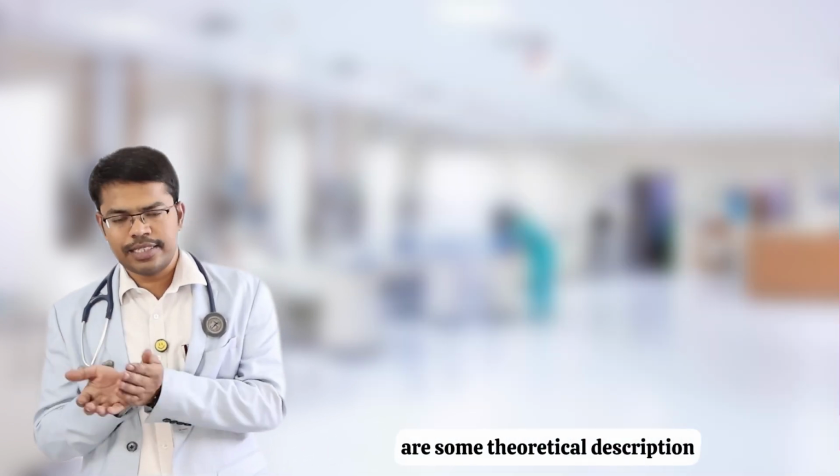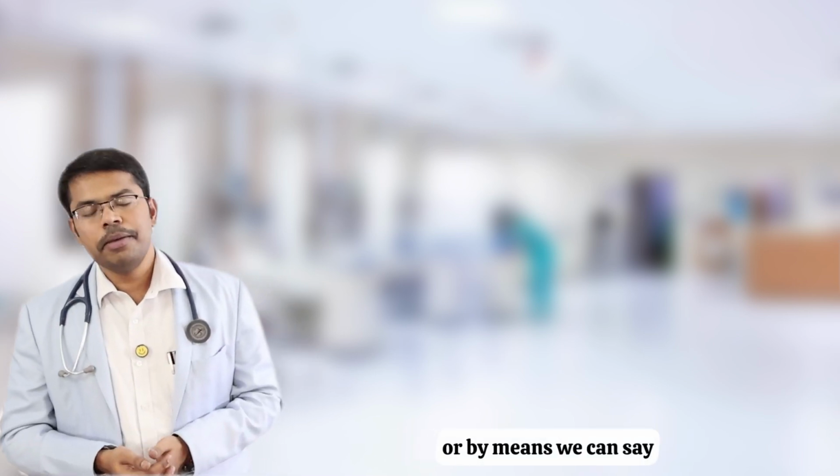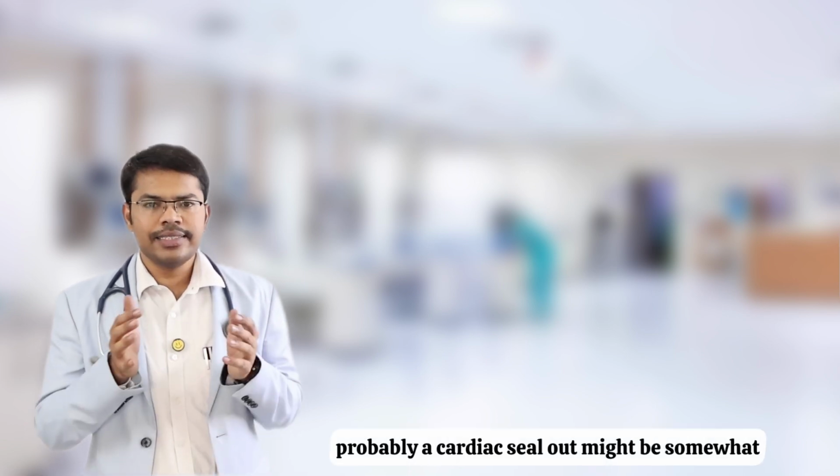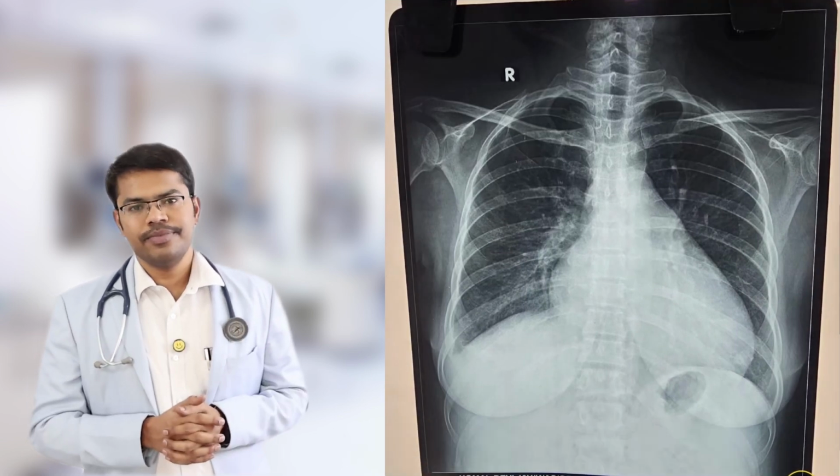These are some theoretical descriptions. But if you find a globular heart, or by means we can say money bag appearance or water bag appearance, that is the large category. Whereas in moderate, probably the cardiac silhouette might be somewhat bigger, cardiothoracic ratio might be bigger.